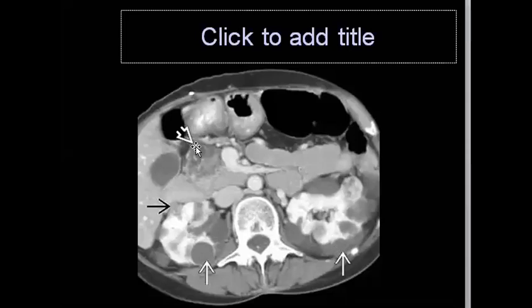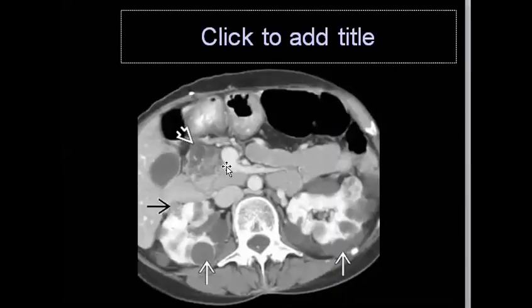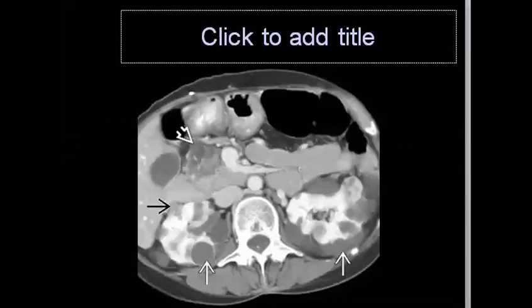And again, a pancreatic cyst, one of the good differentials to put is that this cyst may also be, perfect, RCC with von Hippel-Lindau. Yes. So it has a cystic lesion in the head of the pancreas, and it has bilateral renal cysts. So as you mentioned, it could be von Hippel-Lindau and with RCC as well. Yes, as you see here.